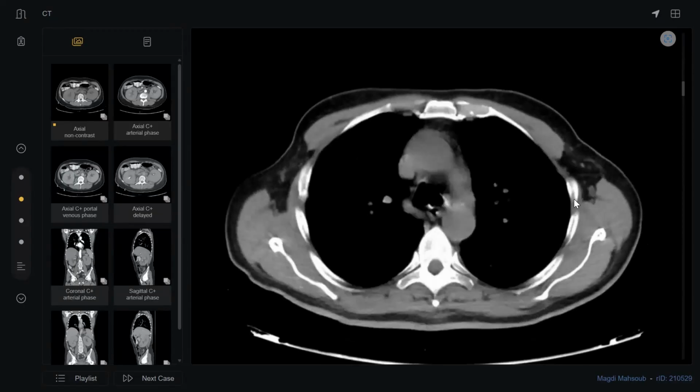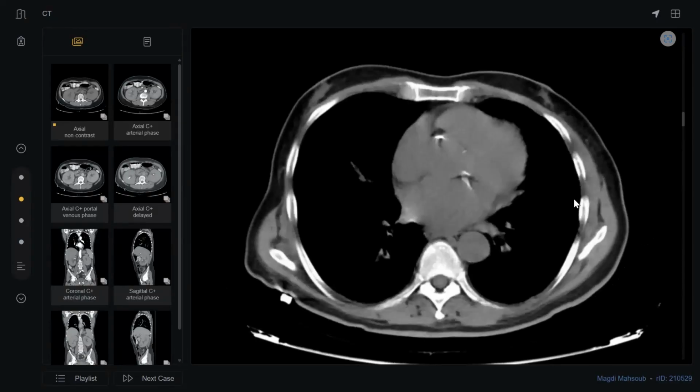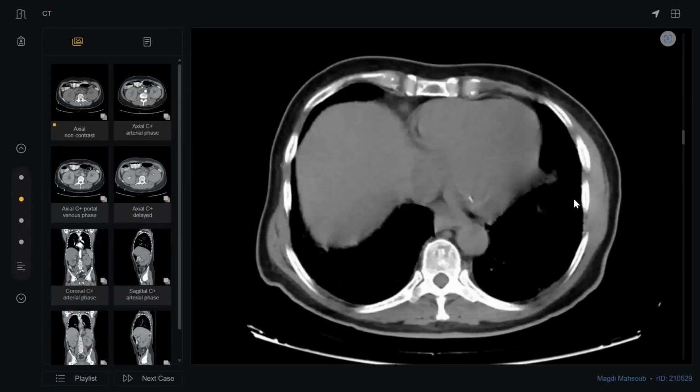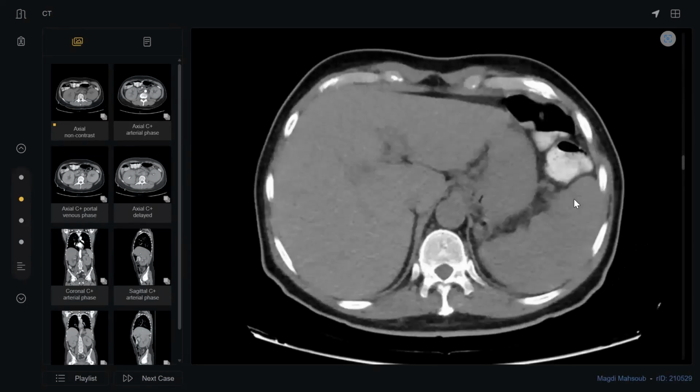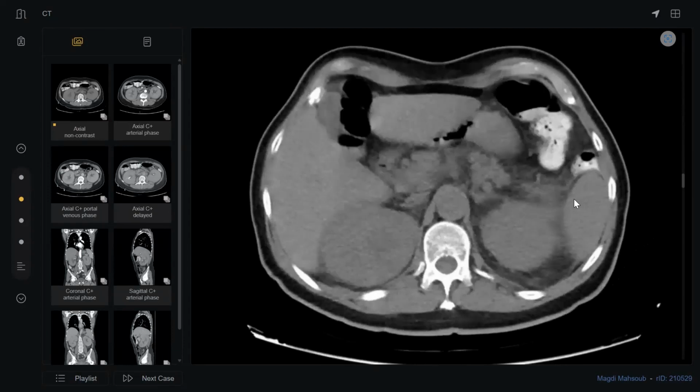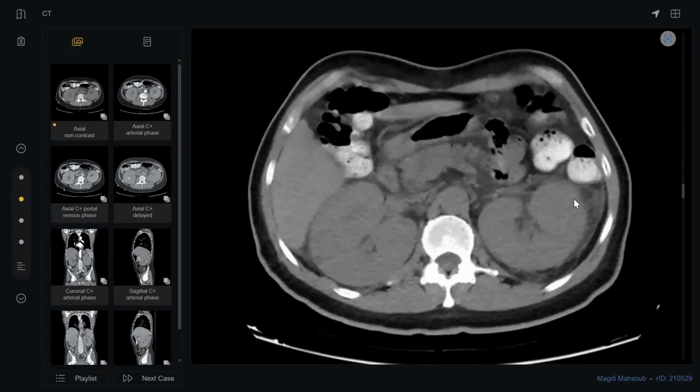Here I am presented with the non-contrast CT scan of the chest and abdomen of the same patient. In this, my target area is over the right kidney, to look at that heterogeneous signal intensity area. Yes, in this I can see it, I confirm my aforementioned finding.